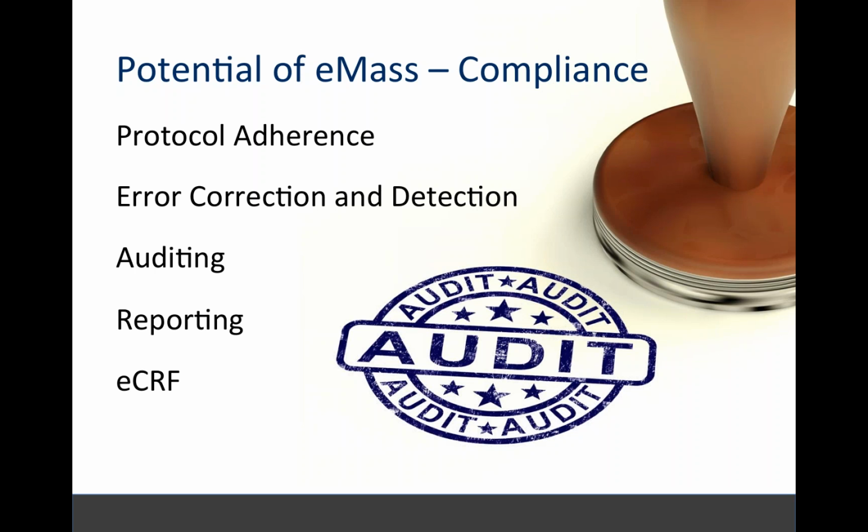So it does auditing, again, on the fly. It does even the visual-based auditing. You get that structured report at the very end, so you can actually see, in a given case, really quickly where two readers might disagree, or what a given reader is doing for their target lesion study.